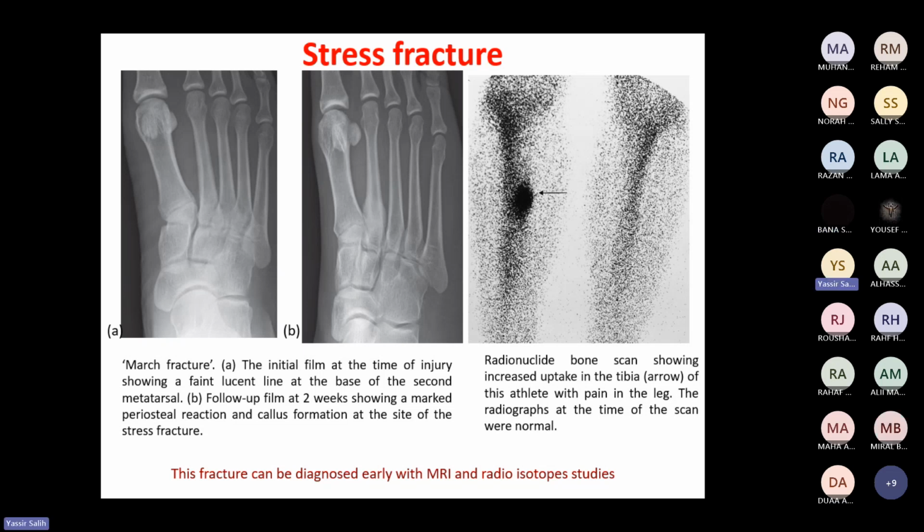It appears more opaque. Yes. So why is this? There is opacity. Why does it appear opaque like this? Calcification, meaning it has healed. Calcification and callus formation, which is healing.